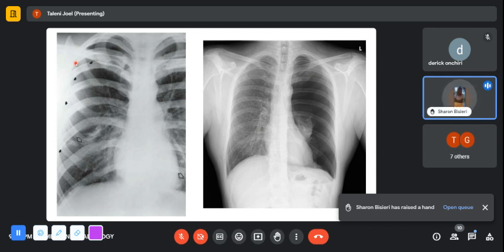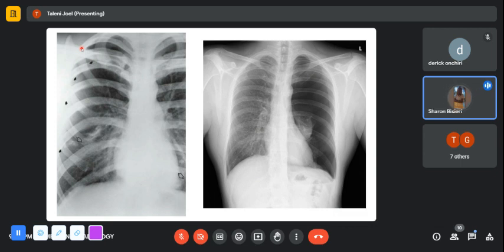On the plain radiograph on the left, what's illustrated by the short black arrows, if you look closely, you can see a faint opaque line. Lateral to it should be the area where we have the pneumothorax, but it extends from the apices almost to the base, let's say the upper two thirds. But you can see that line.